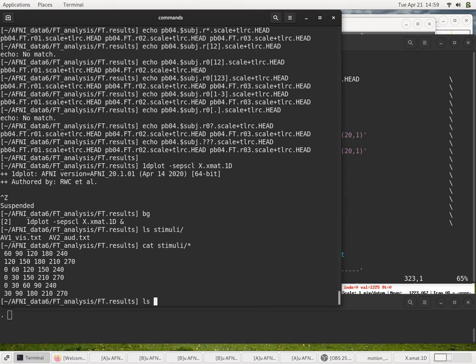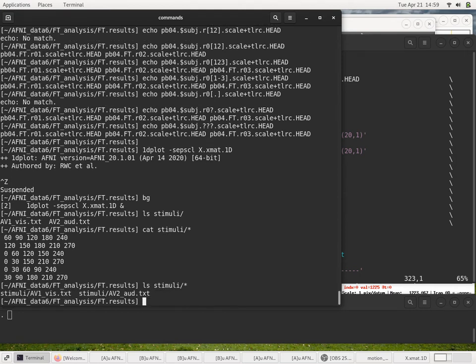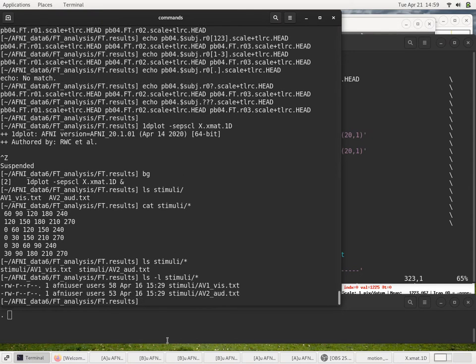And for example, when you type ls, I meant to do a long listing. When you type ls on the files, that puts them alphabetically according to your index. So then when you're handling them, it's more comfortable to keep them in the order that you want, rather than, for example, in some random order based on the label that you named the file with.